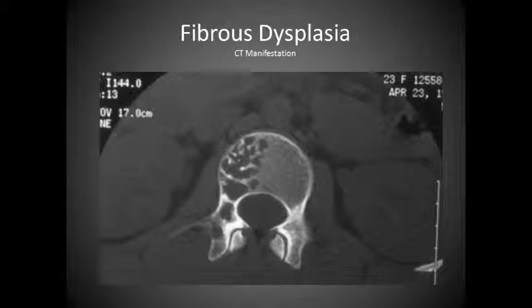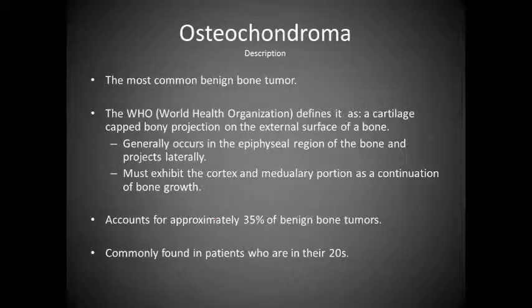Here's potential fibrous dysplasia in terms of looking at the spine. We see that the spine typically looks like this, but there's something inside of it, decreasing the amount of bone and the bone matrices inside. And then it even extends out into the lamina and the pedicles. So this person could have a pathological fracture simply because of the removal of osteoclast or osteoblast.